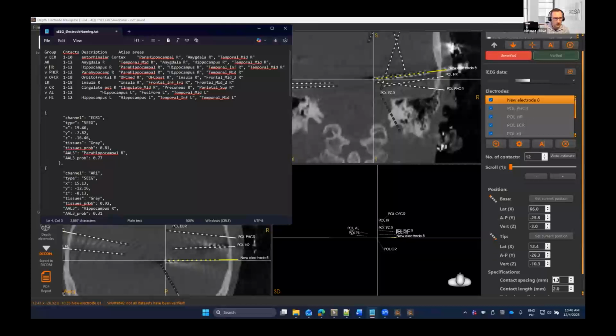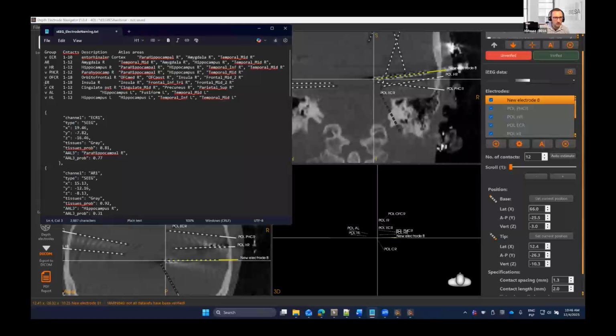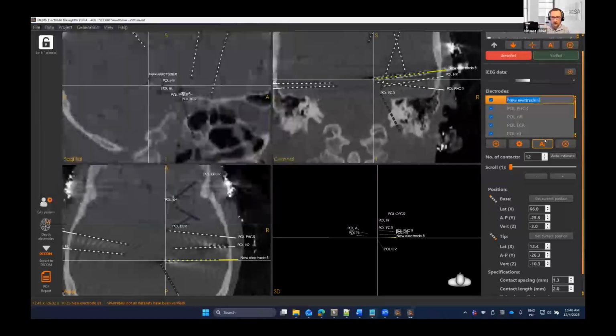Do we have the IR? Did I make any IR? Yes, I did. I just forgot to check that we did it. So this is the AR.